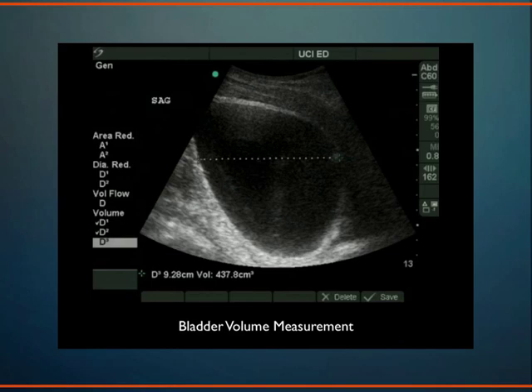So on transabdominal bladder ultrasound, we can measure the dimensions of the prostate. Measuring the prostate and having that post-void residual is good information to have about your patient in many different locations, whether you're in the outpatient clinic, the ER, or the ICU. Does that answer your question?